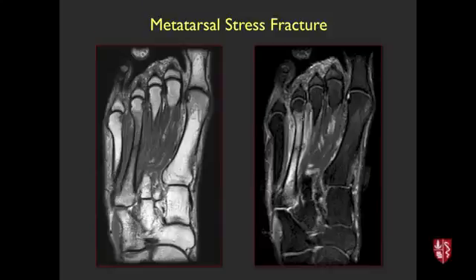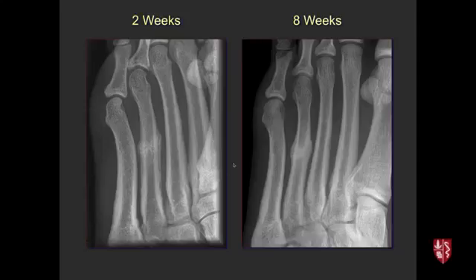Metatarsals. So, going forward to this image, if you have somebody with foot pain, you think maybe they have a stress fracture in the foot, getting radiographs is a really good idea. Now, they may well be normal because the injury to the bone can be too subtle to see until it starts to remodel. But if you get radiographs and they're normal and you can reasonably rest the patient for a week or two and you get follow-up films, that'll often show a stress injury that wasn't visible that then becomes radiographically apparent. And for most of us, that's a reasonable way to manage a patient, right? Depending on where the injury is and what the risk is.